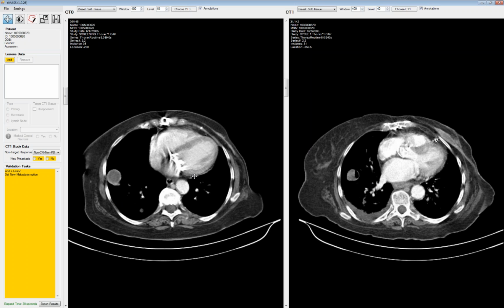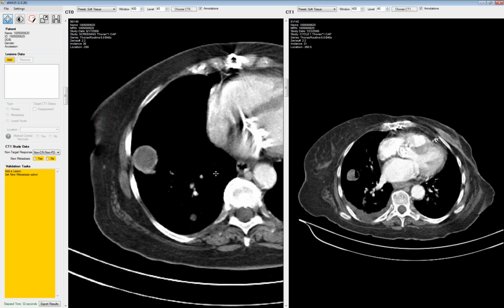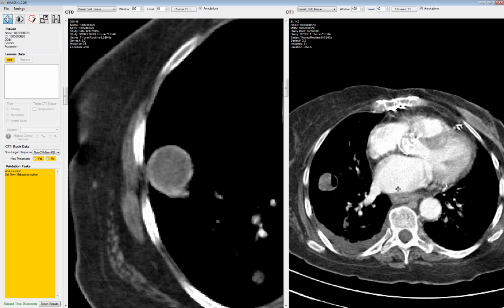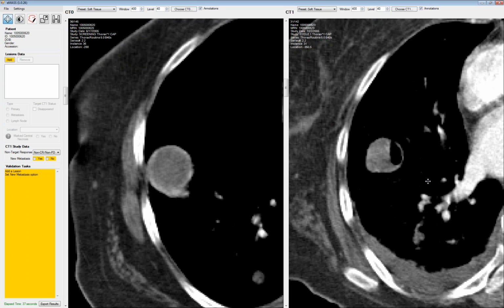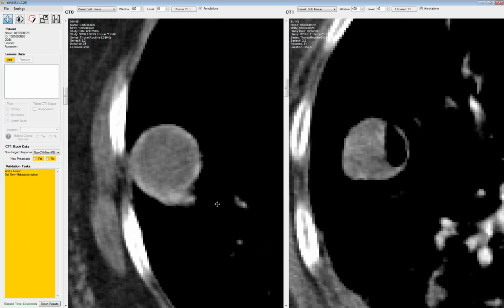And Andrew, as you're doing this, at this point, nothing you've seen here is any different than any traditional PACS software you would use, right? Where the eMass value is kind of right. This is where the rubber hits the road relative to the eMass value, right? Yes, it feels like a PACS. We've designed it that way. It's very easy to change windowing and so forth.